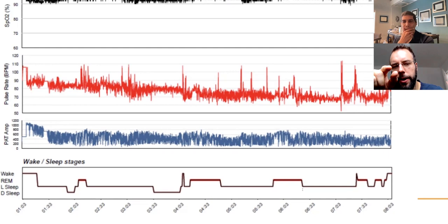How accurate are those wakings? So this waking up is, let's say, an elusive term, because there's EEG waking up, right? Measuring very sensitively with EEG leads. How does that map over to what the PAT gives? So, in other words, let me put it quite simply. The 2 wake ups that we can see here in PAT, would you expect that the EEG would show many more wake ups, or do you think this patient just doesn't really wake up from their sleep disordered breathing?